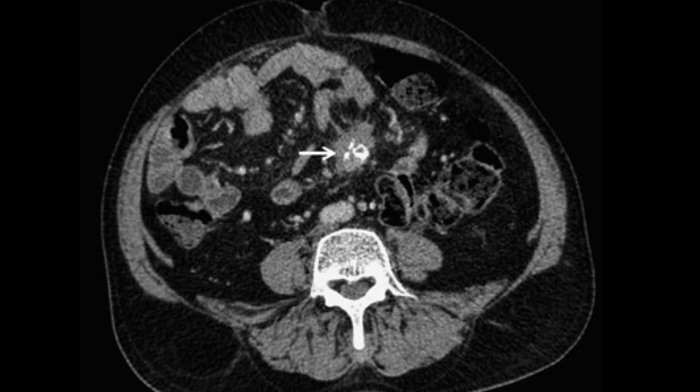I am given a contrast enhanced CT image of the abdomen, which is showing a spiculated lesion present in the center of the mesentery, with a hyperdense focus within, which is nothing but a calcific focus, and this lesion is seen to cause some desmoplastic reaction. We can see some haziness in the mesentery and some tethering of the bowel, suggesting a desmoplastic reaction has happened, and there is some hazy fat seen around.